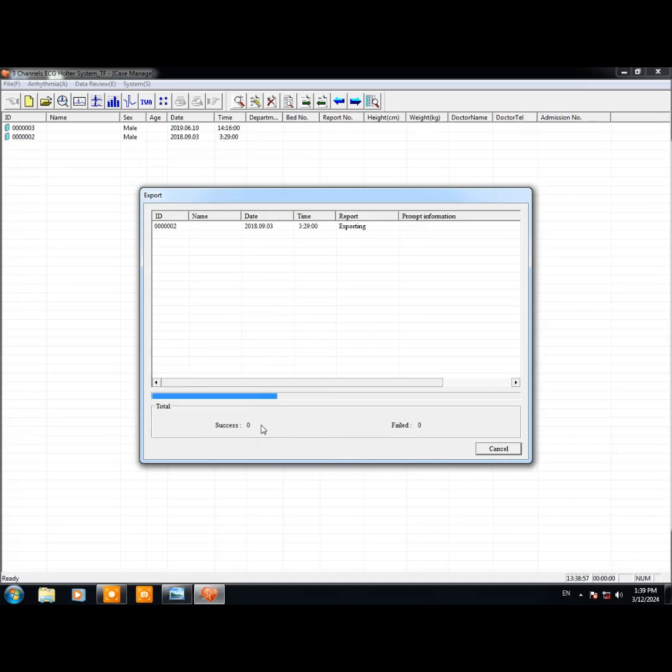Success will be 1. It's almost done exporting.